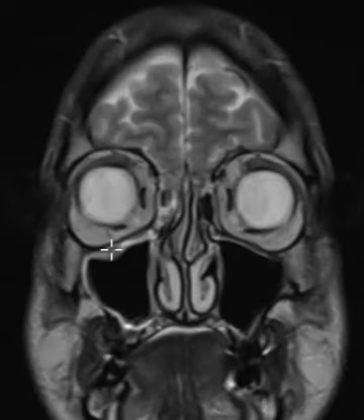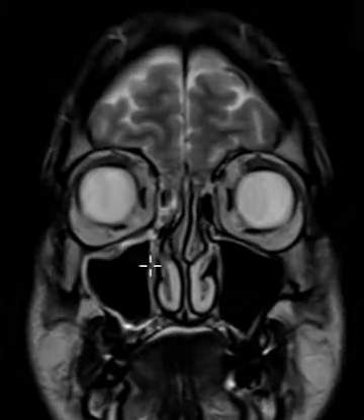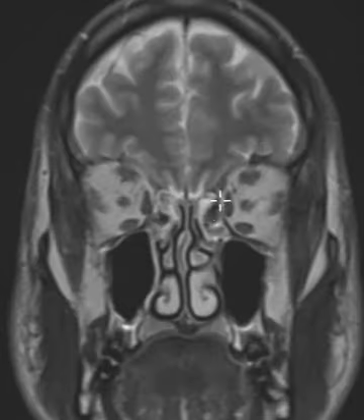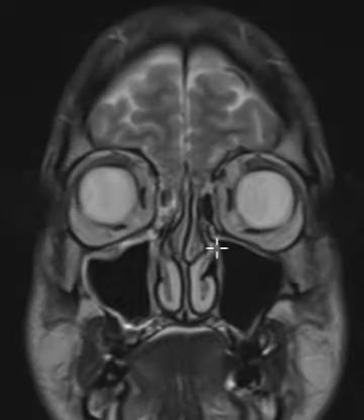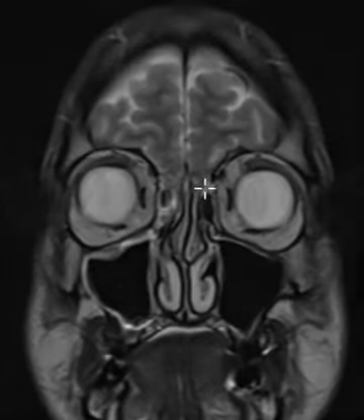And if we come down here, the right maxillary sinus had a thin rim of brightness. And so this is mucosal thickening, and this mild mucosal thickening can cause headaches. So you can have sinus pressure headaches, and we're not sure if that's definitely what the problem is, but the remainder of the brain was normal, and this would be a plausible cause of the finding.